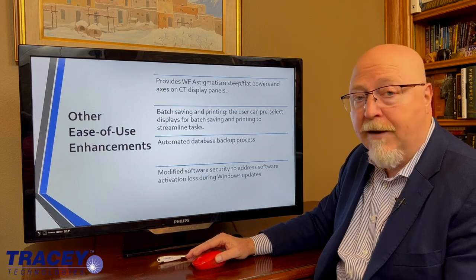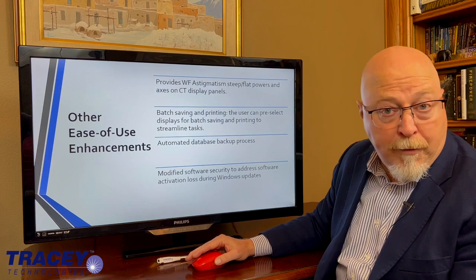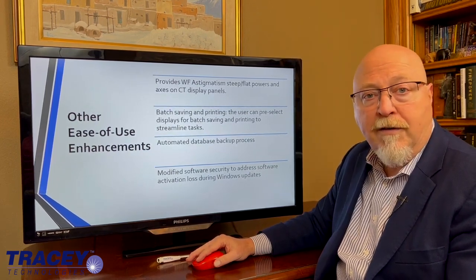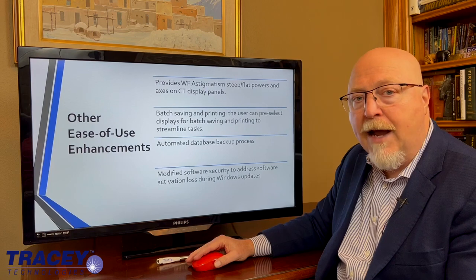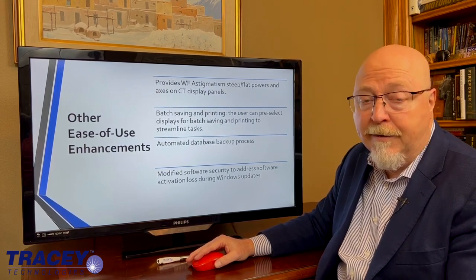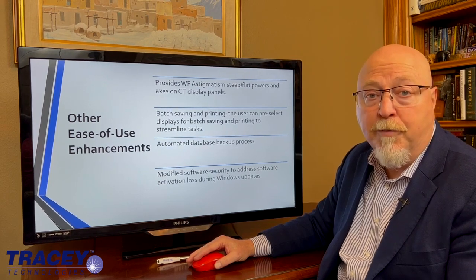There's tear film index, there's color capture photography, infrared, there's the corneal performance indices, the quality of vision. There's just a whole lot in version 7 software. If you don't have it, you should consider upgrading. It'll cost you something, but it'll be well worth it. It makes your iTrace even more usable. The utility and capability of this device is continually expanding, and version 7 software is a major improvement in your iTrace.